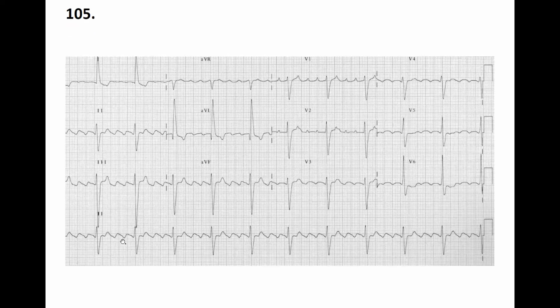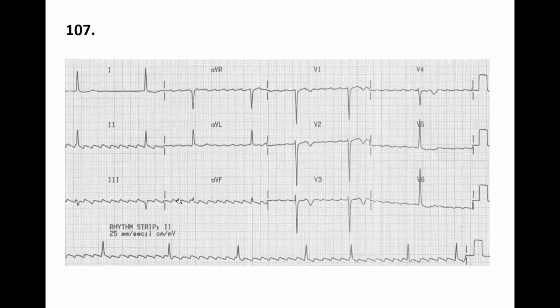These are very nice saw waves. Okay, so this is the atrial flutter. Good. Okay, let's move on.